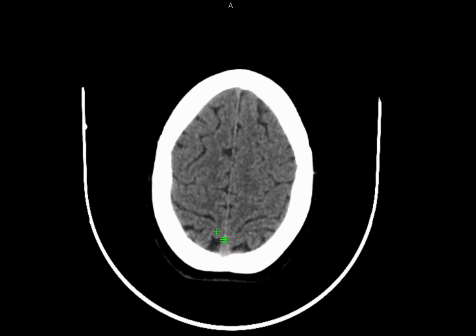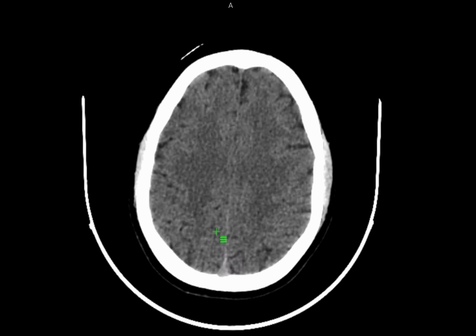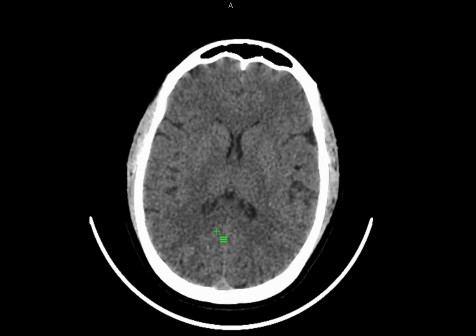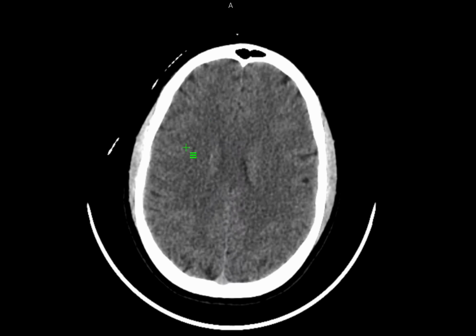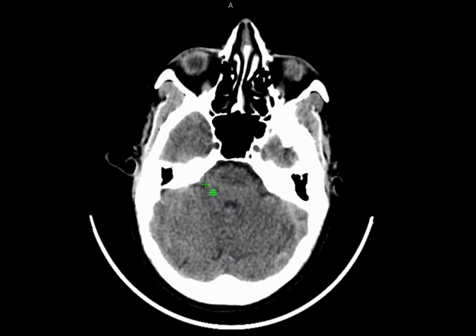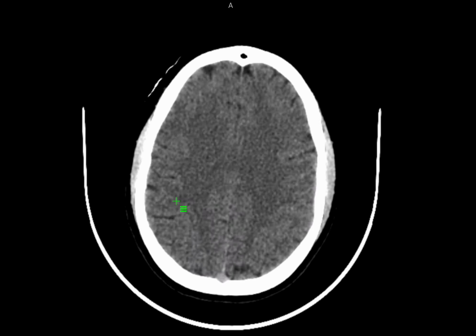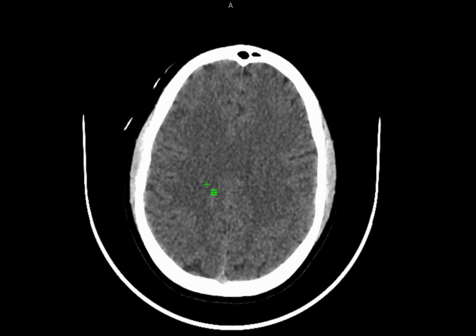You can go part by part and look for pathologies, and otherwise, once you are in the starting of your residency, another easier way to pick up everything will be you can divide the brain into 4 quadrants like this. And for example, let's say look at the right upper quadrant. So a quick one scroll, just focus on the right upper quadrant and look for any pathologies. Now once you scroll up, you look at the right lower one, and the same way for the other 4. So these 4 quadrants, if you go like this, it is less likely that you will miss out anything.